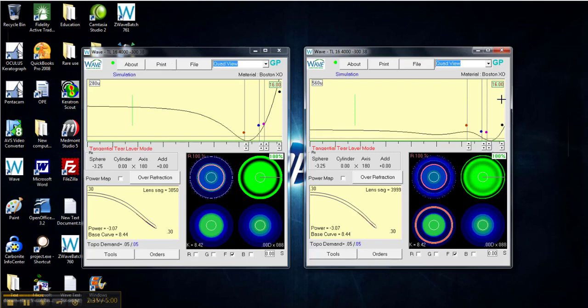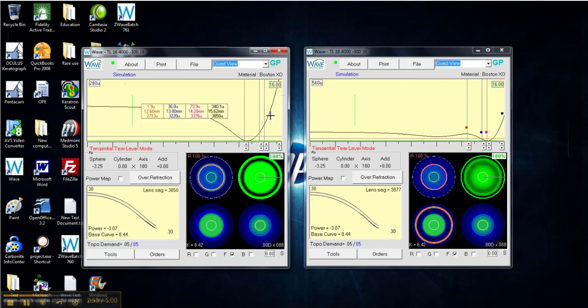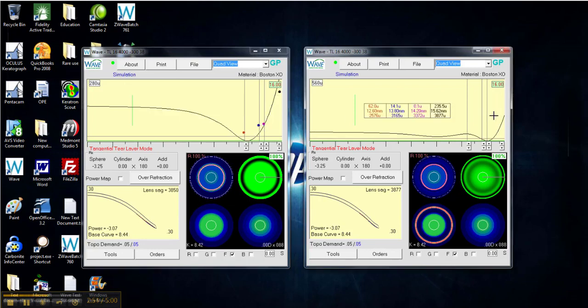Now, in particular, the information I want from this design to the left that I saw in the eye is I want to look at the edge angle. It is 38 and 34. And I want to look at the sagittal depth at the pink control point, which is 3376. So let's look where I am right now. We're at 3372, getting pretty close.